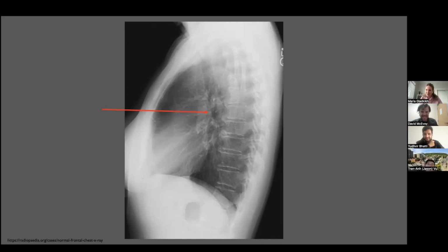Honestly, lateral radiographs, even now, if I open it, I know the approximate locations of the structures, but unless you're practicing it all the time and looking at it and really hammering your anatomy down, it's hard. So the things to look for on lateral radiographs. This is actually the right pulmonary artery, and I'll go into it in a second.